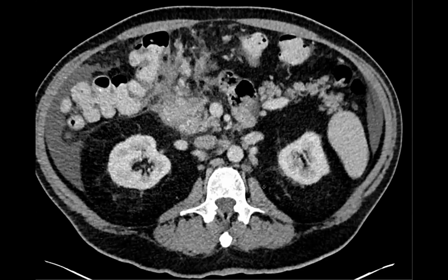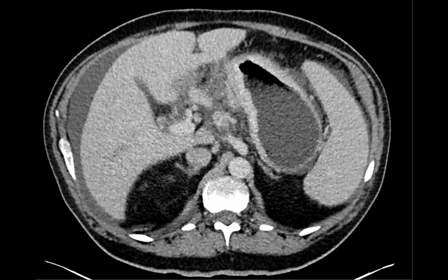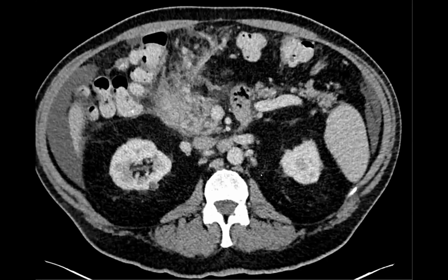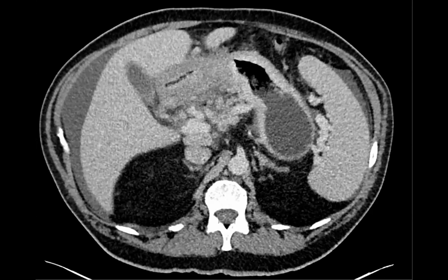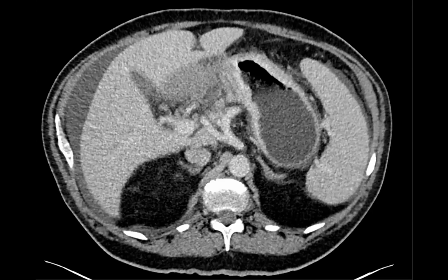So I just thought it was an interesting case of linitis plastica causing biliary obstruction, and also this probably metastatic retroperitoneal node. This is a great case. And many times for less advanced cases, I think it's very hard to call prospectively. Yeah, gastric cancer can be really tricky.